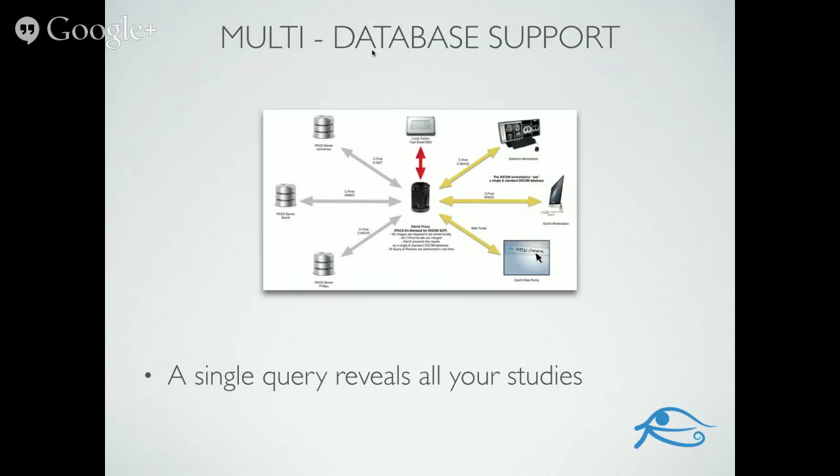This would be a single instance of OsiriX running on a device that has a local database, so images have been stored on the local database, but locations have been set up on that same OsiriX workstation. For example, perhaps to a Siemens workstation, another OsiriX workstation in the practice, maybe your web portal, maybe your enterprise PACS system. So those connections have all been built under locations.